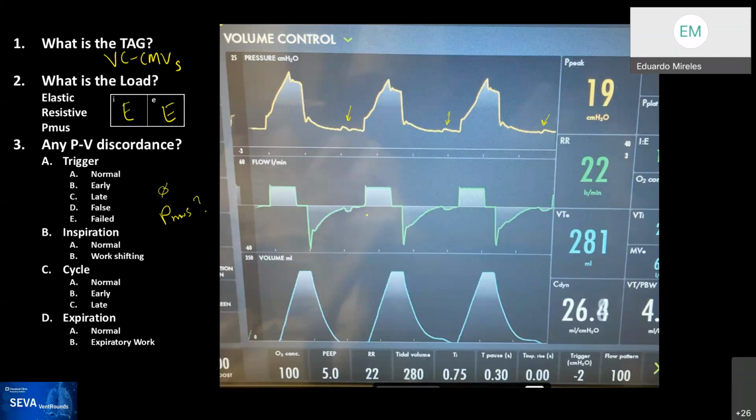So I think the pressure is a kind of hump, which means I feel that this is more probably a chest wall issue, perhaps. Maybe something active at the very end of exhalation, or the chest wall compressing and increasing the pressure, because I think there's an outward hump slightly. Yeah, good point. So you're seeing a change in compliance, right? Yes, something is causing what seems to be a change in compliance.